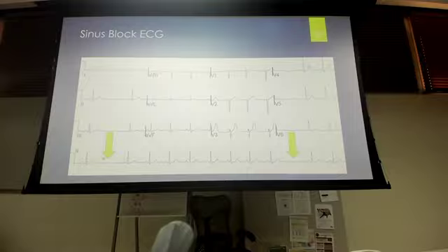We look here, we've got our PQRST. It seems like we have a long way between this R wave and this R wave. We could think of this as an escape beat, just an escape rhythm, right? So sometimes that's the case, but if we were to march this out, we should have an R here, and then this R line. Escape is just a little bit later than normal. It's not a complete cycle, it's a cycle, and then a little bit later after that cycle.